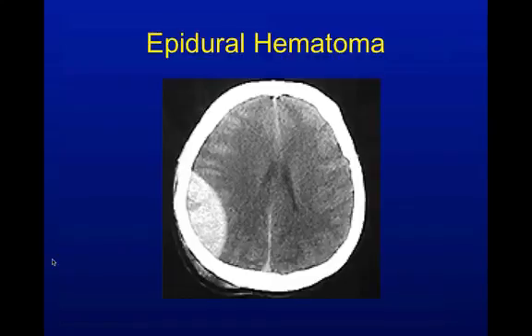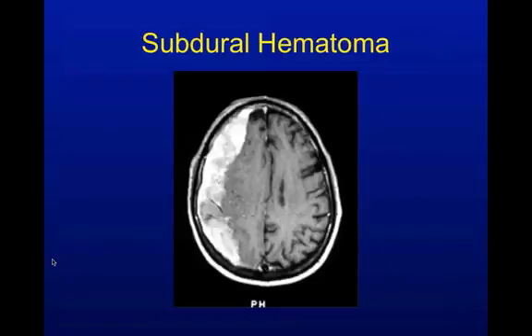So epidural hematoma. Let's see if I got a pointer. Yes. So we have a beautiful lens-shaped hematoma here. We're not going to have time to go into histories on patients. So this is one of these doorway diagnoses. You just kind of throw the image up, the representative image. Boom, there it is. This is what it is. Move on. Okay. Maybe a little hint of some mass effect. The ventricle's a little collapsed over here on this side. So epidural hematoma with a little bit of midline shift.